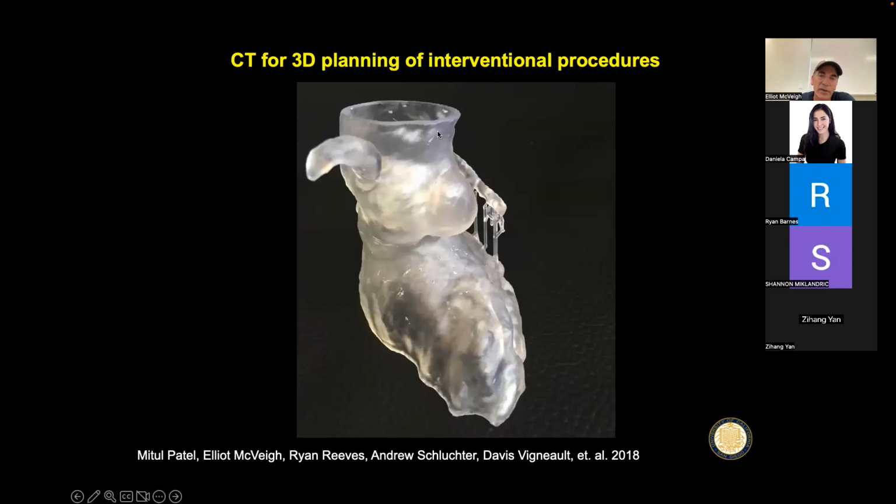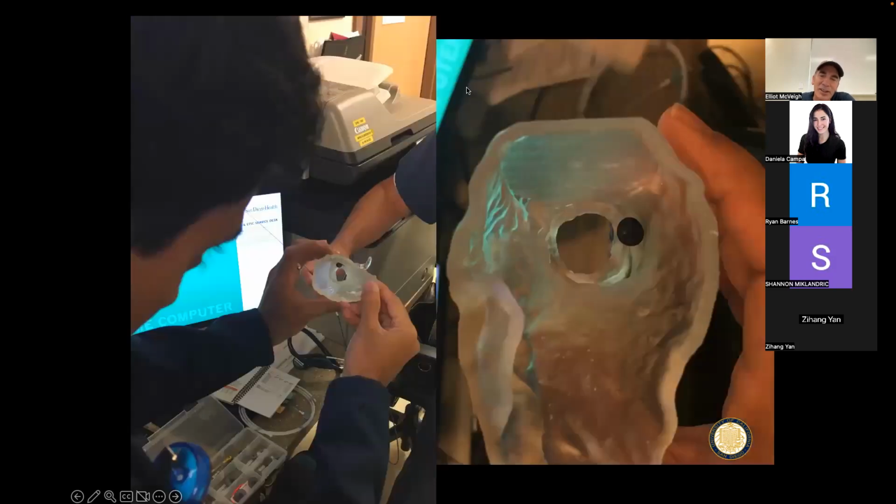So we have the walls of the valve here, and there's this aneurysm here. Here's the left ventricular blood, with the coronary coming up that way. And inside is the surgically implanted valve that exists right now. These are called Amplatz plugs, right?